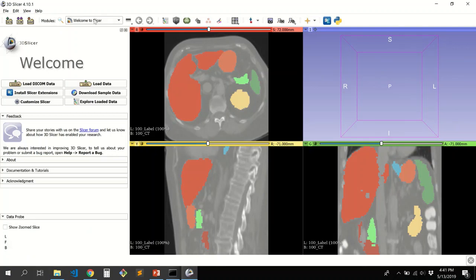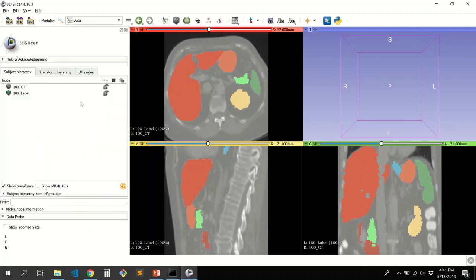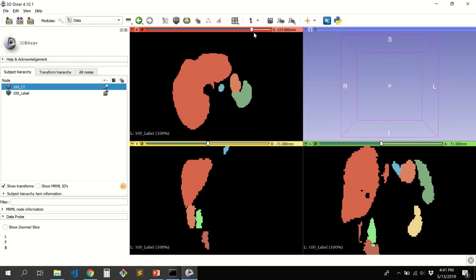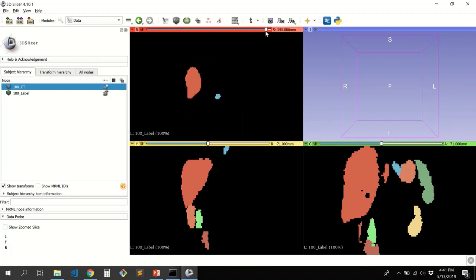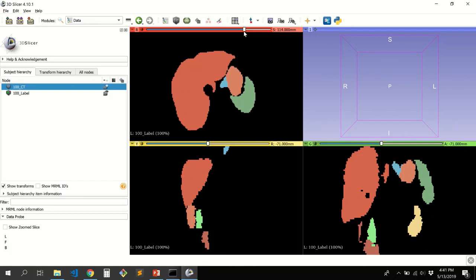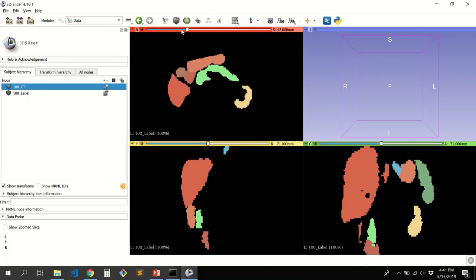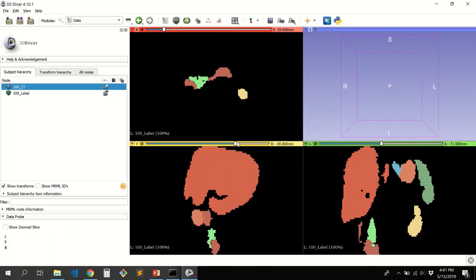Great, so I have data. This is my label. It's a 3D label of the components, each in one color. I'm sure there is some configuration file, or a comma separated value file, that defines which color or which index is associated with which organ.